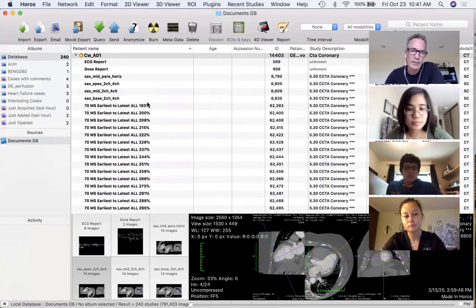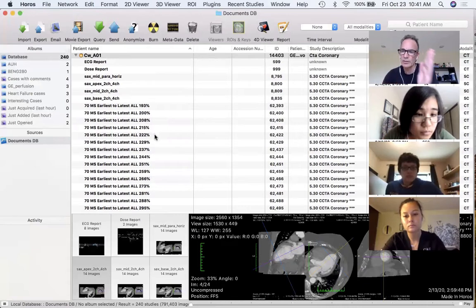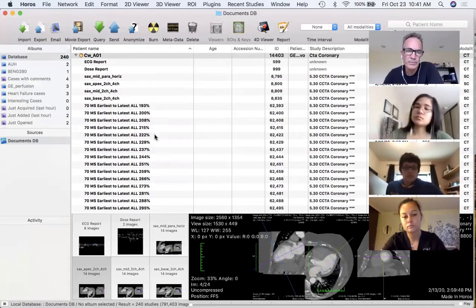So what these percentages mean here, and forget the first digit, but the 00, 08, 15 is 0% through the R to R cycle, 8%, 15%, 22%. So we're stepping through the R to R window of the QRS. So these are just equivalent to time delays in the images.